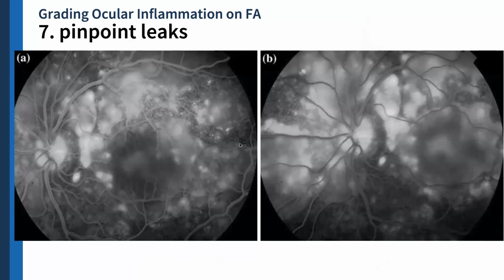Okay? So the other points, we will skip na yung retinal non-perfusion, yung neovascularization, kasi you guys, I think, are already familiar with that. So particular for inflammation would be the pinpoint leaks. So yung pinpoint leaks naman, they are representative of choroidal inflammation.